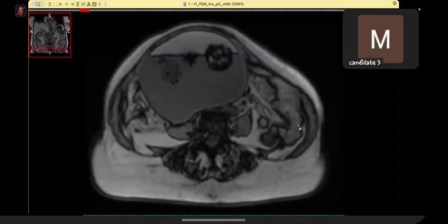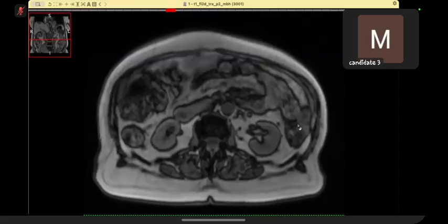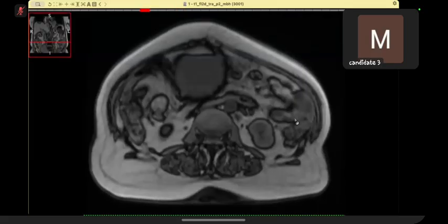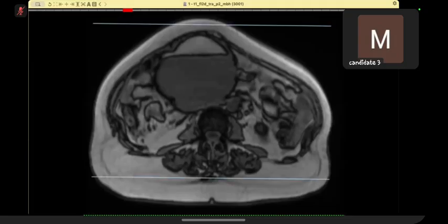Yes. So in my routine practice, I will review the patient's previous record for any known pelvic mass lesion in the past. Considering the presence of large size and fatty component, I am concerned about malignant transformation in some old dermoid cyst or a primary malignant ovarian mass. I'm also concerned about the nodularity of the peritoneal outline, for which I will look at the post-contrast study to rule out any peritoneal metastatic disease.